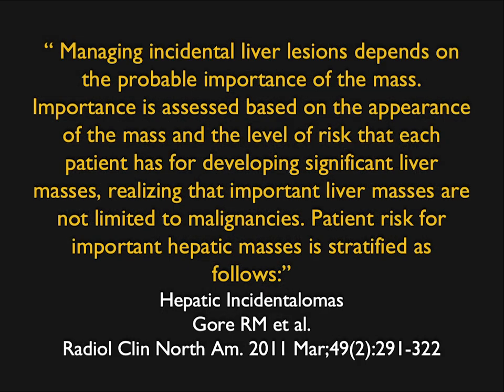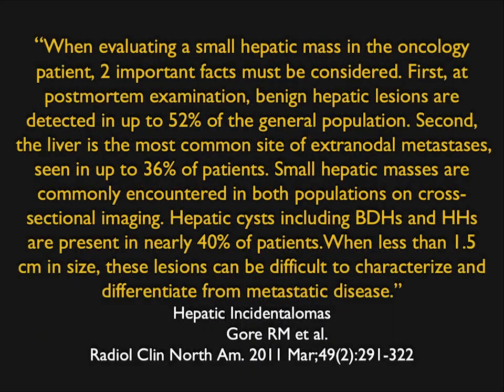Now, what about the liver? Well, we don't want to leave the liver out. We commonly will see liver lesions. Most of the time, they are going to be benign. A small hepatic lesion, very commonly in the right lobe of the liver, is always to me a hemangioma. Now, of course, history becomes important. When you don't know what small liver lesions are, they are more likely malignant if the patient has a known malignancy than as an incidental finding.